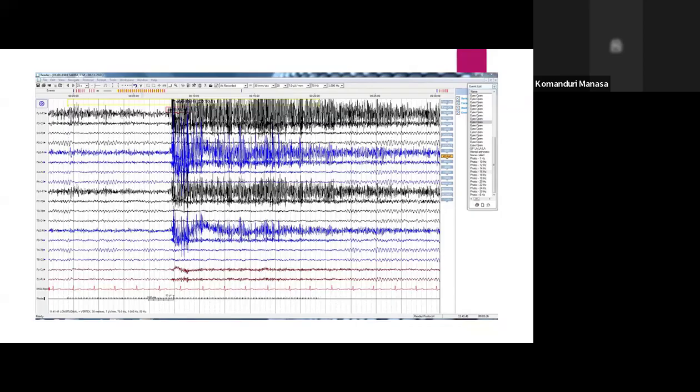You can get generalized responses, which often outlast the stimulus. So it can start in the occipital and go into the frontal region, like a photoparoxysmal response, based on the grade.